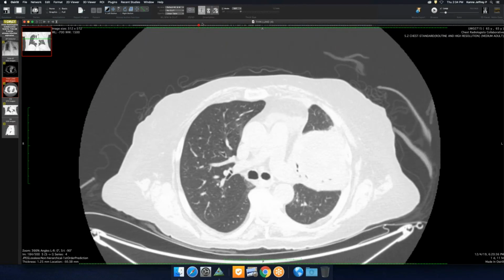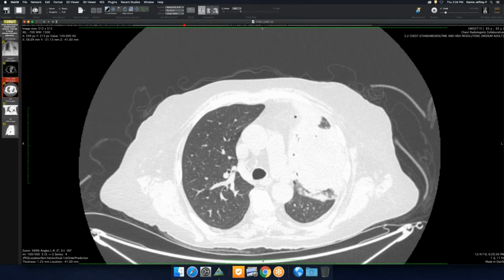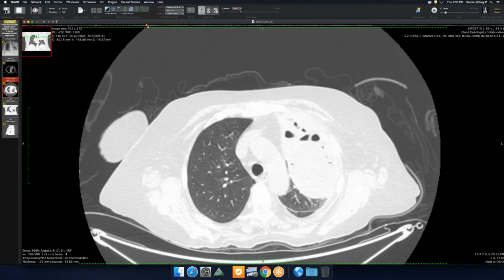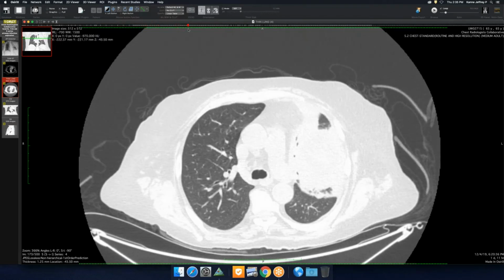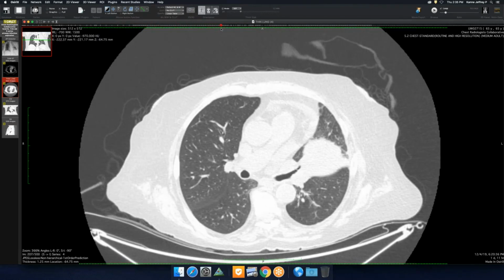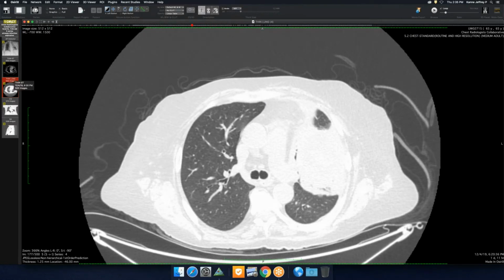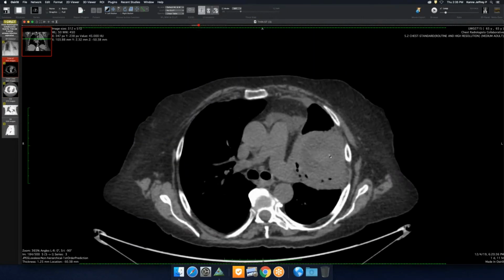They can spill into the other lung. They can cause ARDS. And you can see it's deflecting the airways there. In this setting, the timing of it, I can't remember, it popped up rather quickly. It was treated as an abscess and started to slowly resolve. But what does it look like on the mediastinal window? Is it all low attenuation? You can see it's very heterogeneous, but it's got a lot of liquid in it.